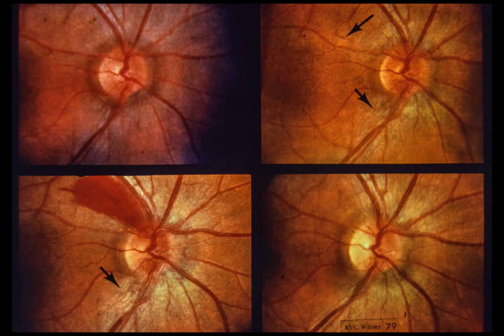An intracanalicular meningioma was suspected, and, despite unremarkable neuroradiologic studies that included optic canal polytomography and pneumoencephalography, the patient underwent craniotomy with unroofing of the left optic canal. The intracranial and intracanalicular portions of the optic nerve were normal. Upper left. At the time of initial visual difficulty in the left eye, the right optic disc appears normal.